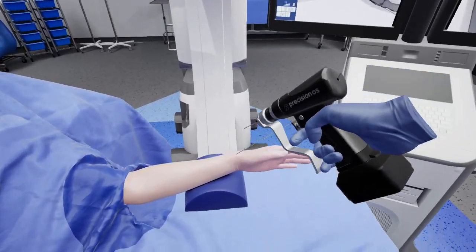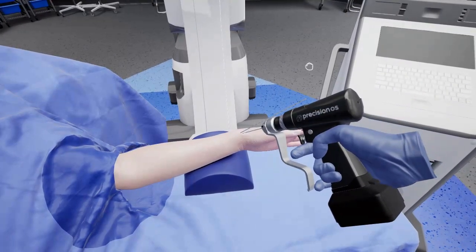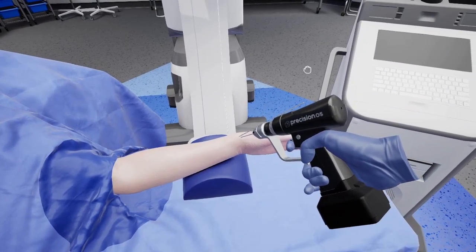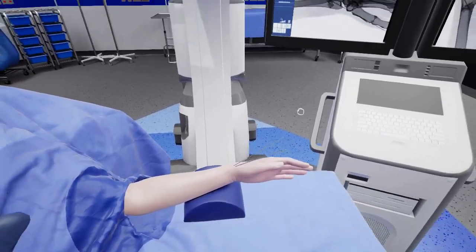Users are provided final metrics at the conclusion of the case. This allows them to complete the case at their own pace, and then after the fact, visualize how they've done with our key metrics provided.